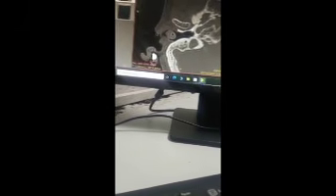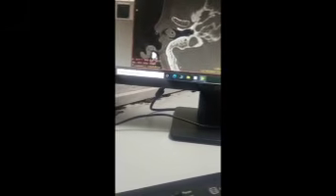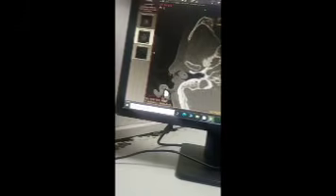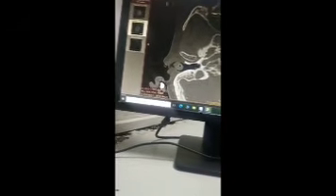Now we will start with the external ear. Here you can see the external ear. The patient has worn some ornaments in her external ear. The patient's age can be seen here, written above the name. From the external ear we will start looking inward.